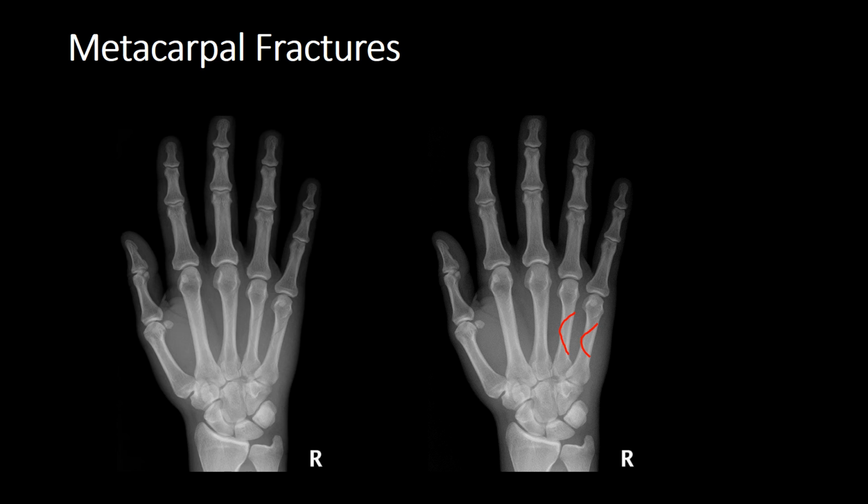An oblique fracture is when you literally have a single fracture line that doesn't curl around the bone and it literally is at an oblique angle. So in this example, this is a really good example of spiral fractures. So always scrutinise carefully to see if you can see any lucent lines, and as I said, it's important that if you ever see a fracture you keep searching the rest of the film so that you don't miss any further injuries.